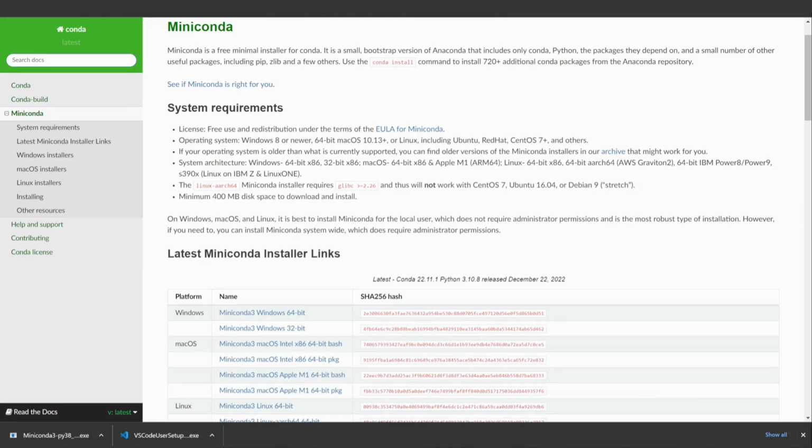So in this case, you always need to have a virtual environment specific to that project. You can install, for example, a version of pydicom, which is 2.1, for example. And for another project, you need 2.8, let's say. And so you need to have two different virtual environments, and each virtual environment contains one pydicom version. And the same thing for the other packages.